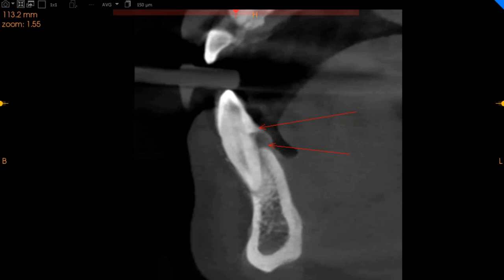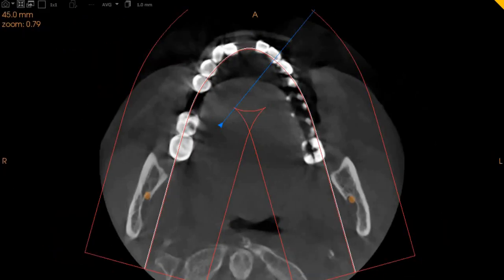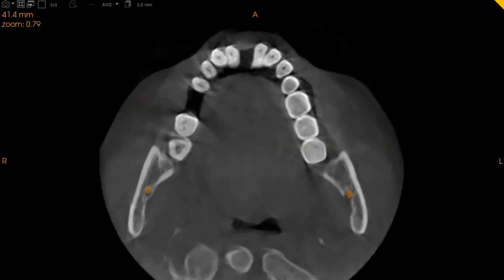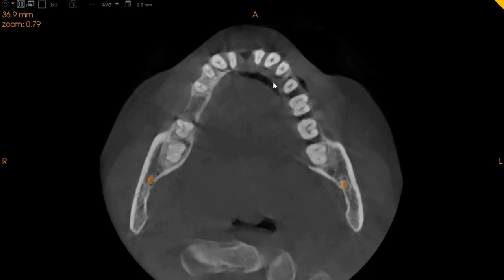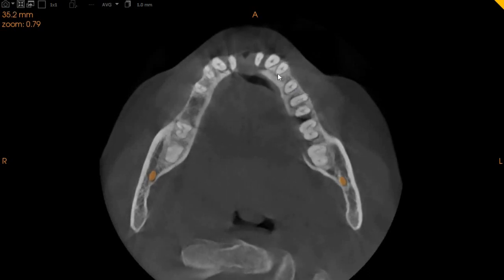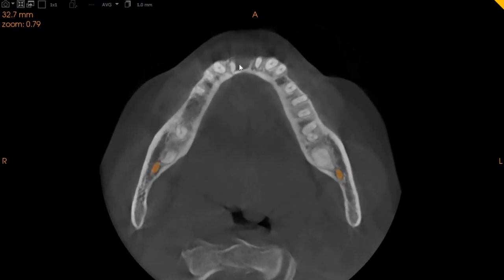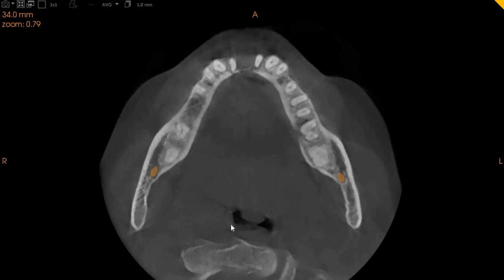Now moving to the axial view, which is basically the top to bottom view. On the axial view, we will be able to show you the bone quality. So here you can see significant calculus on the linguals, no bone, and then very close to the apex is where we have some bone, but the laterals have zero bone. Canine has good bone support from the middle to the lower 1/3. And there's very excellent bone for the molar on the right hand side.